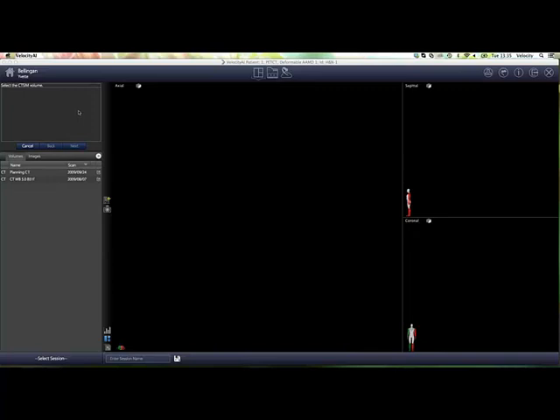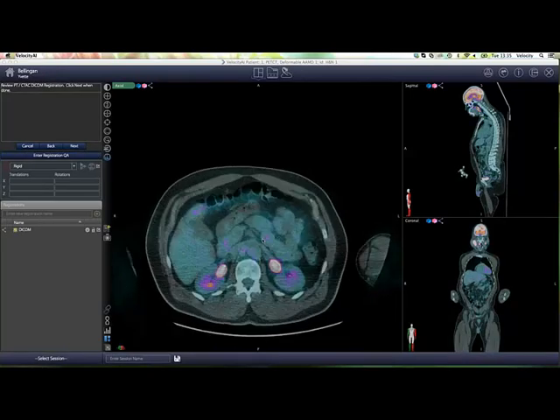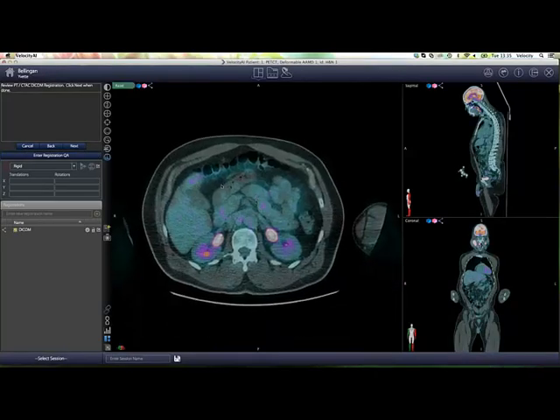If we go to the side-by-side view, my secondary image is the colored image. My primary image, as you can see, is the gray image. And if we go through, you can see I've got a huge discrepancy in the patient position. My PET CT has quite a bent neck, and my planning CT is in a nice neck straight position as we used to in oncology. So I will do a manual alignment.